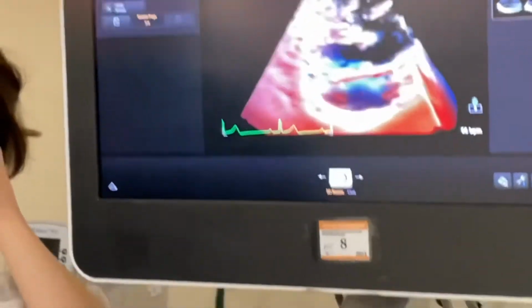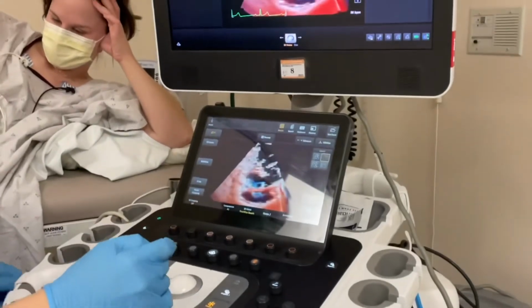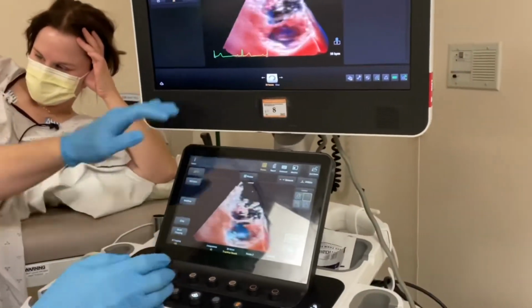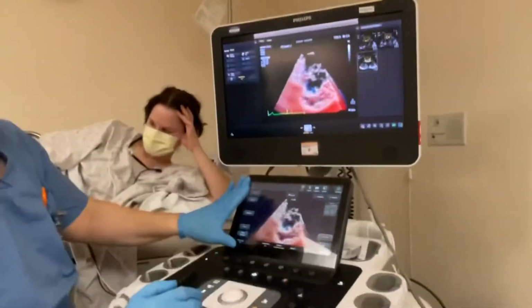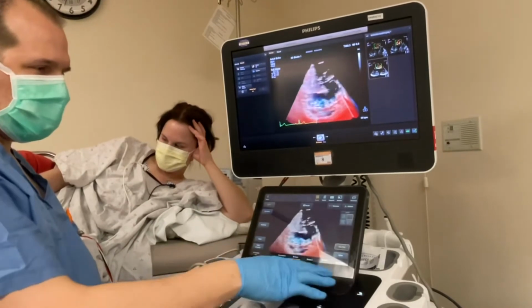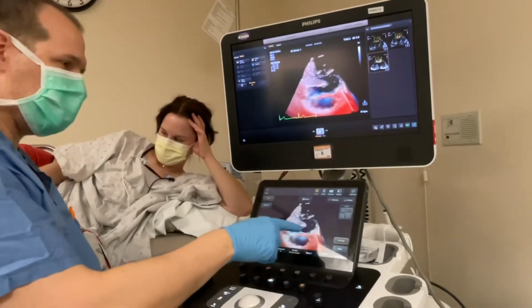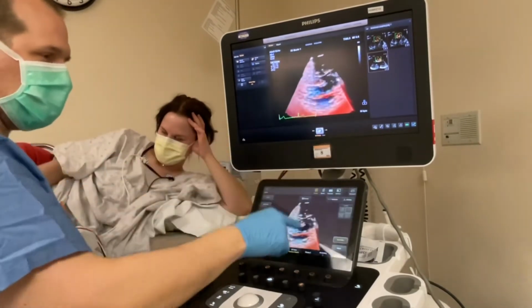So what we do is we'll hit our touch view button here, and then on our screen we'll have a replica of what we see here. We'll also see it on our screen. And then to activate the light depth, we just hit our screen here, and it will also show up here.